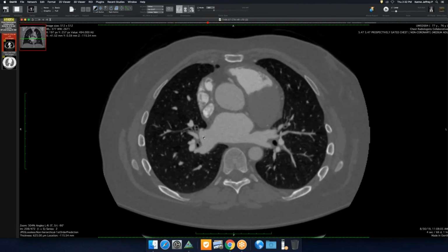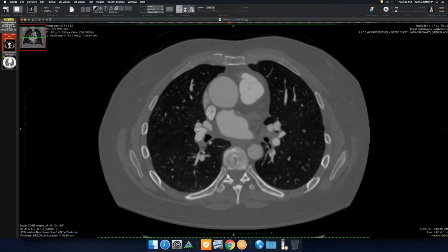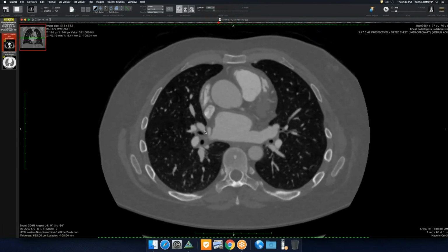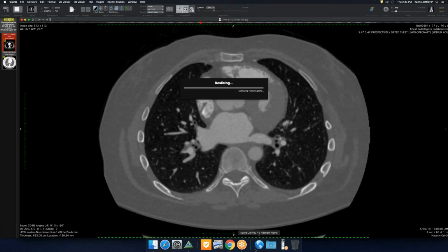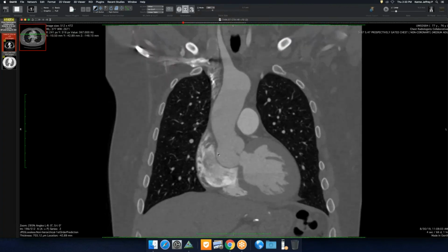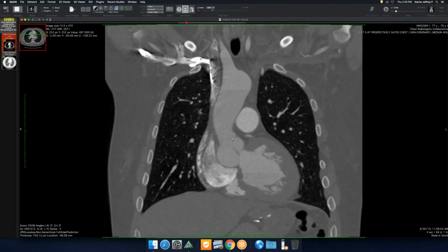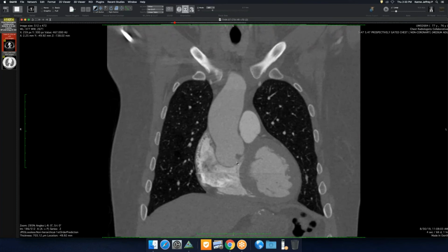All the right pulmonary veins come into this little compartment here: the inferior, the middle lobe, and this meandering vein coming from up top. And there's also a superior vein coming in, and they all kind of drop in here. So multiple congenital anomalies. I'll do the coronal to show you that ascending aorta. But you can see the high origin of the left coronary just above the sinuses of Valsalva there, with what I think is a unicuspid valve.